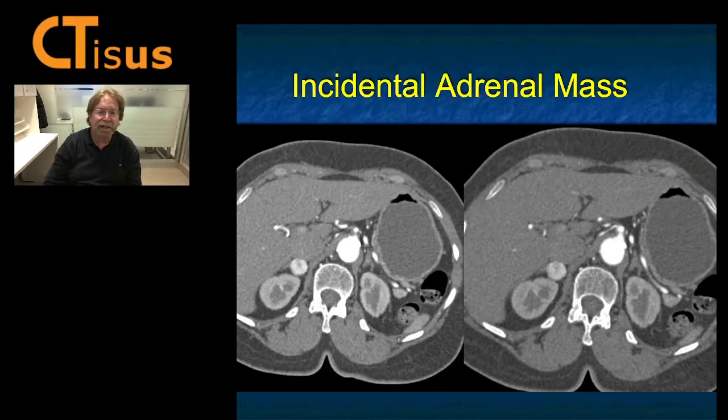Okay, next case. Incidental adrenal mass. Now, I was quizzing people on a number of strange adrenal tumors that we had in practice, but I wanted for the fellows to show them a real pheo that you don't have to think about, because I showed a bunch of pheos that were atypical. Hypovascular, cystic, and hypovascular. But here's a mass under 2 centimeters, hypervascular, right adrenal gland.